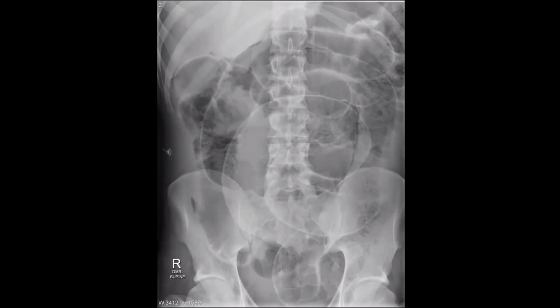I think you got the idea, the message that I want you to know. As you said, we have diffusely dilated bowel loops involving the center of the abdomen. So we have dilated small bowel loops and also dilated large bowel loops. Look for the sigmoid colon and rectum. On top of that, we have evidence of pneumoperitoneum.